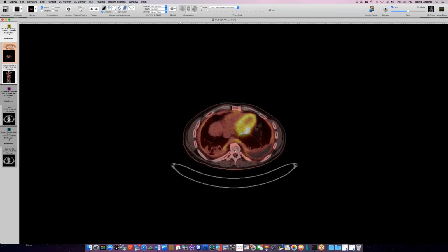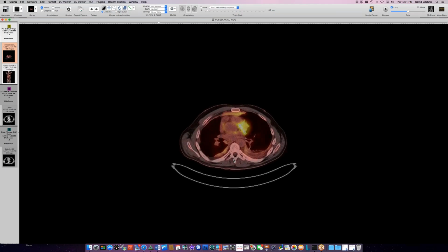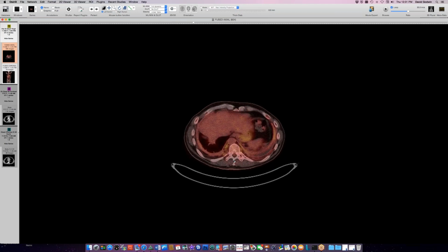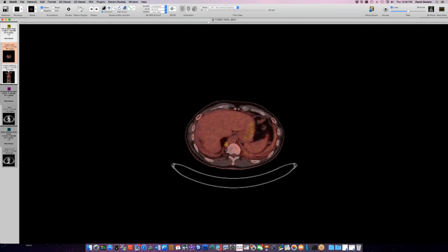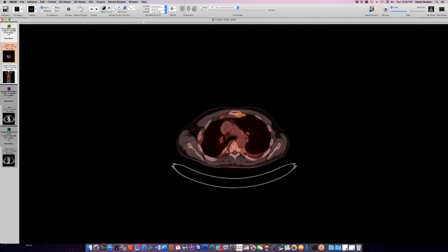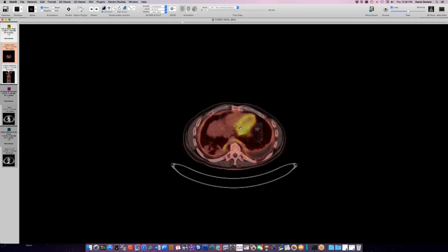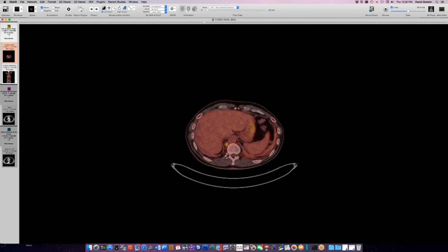So at this point, what's odd about this for just pleural disease, there seem to be nodules in the extrapleural fat that are even FDG avid in the posterior hemithoraces, like nodules of tissue in the extrapleural fat. Correct. So there are some hot lymph nodes here, and there are some mediastinal lymph nodes that were hot too, and that's why the biopsy included a mediastinal lymph node, and that had the same plasmacytic infiltration in it. So I think the lymph nodes are involved.